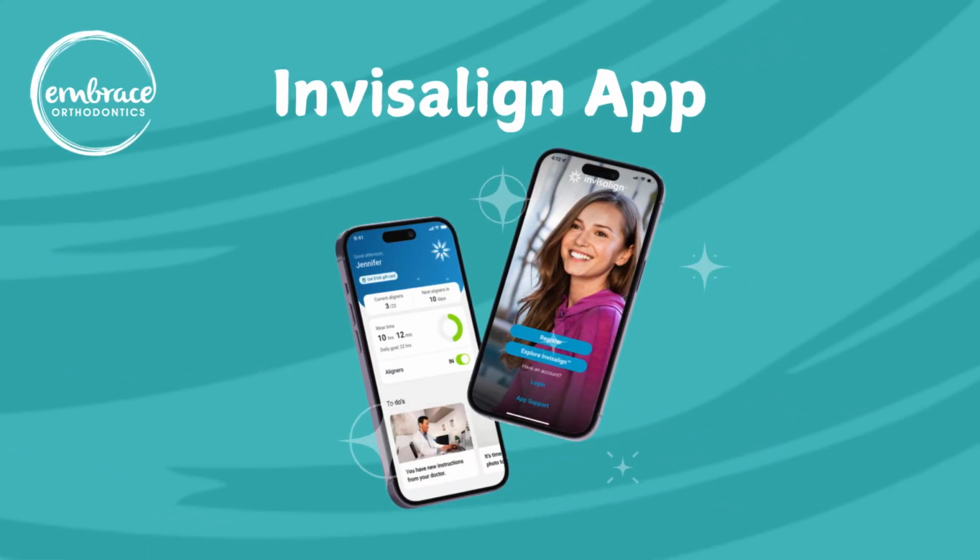Those are the main aspects of the Invisalign app that we will be using throughout your treatment. Hopefully, this tool will help you feel more confident and on track with your Invisalign journey.